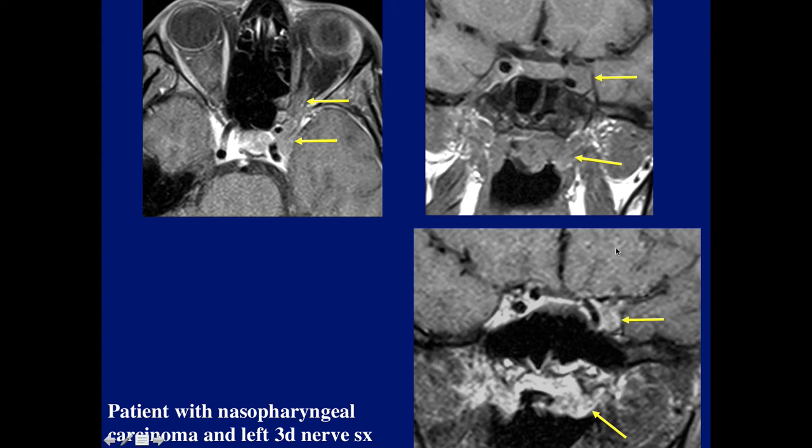They had a nasopharyngeal carcinoma that we can see here, and had perineural spread to involve the orbital apex. As you can see here, loss of the enhancement of the veins within the cavernous sinus and the orbital apex, and extending into the orbit. So this is orbital apex disease of a nasopharyngeal carcinoma, which started in the nasopharynx.